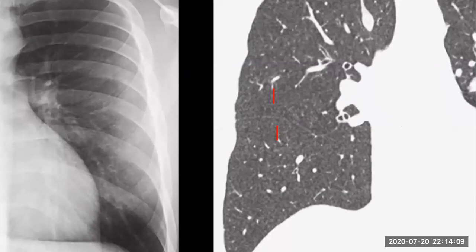The above one is oblique or horizontal? Are you sure? Horizontal, it separates the upper lobe from the middle lobe. Okay, then the horizontal and the oblique fissure, and in between is the middle lobe. Okay, very good.